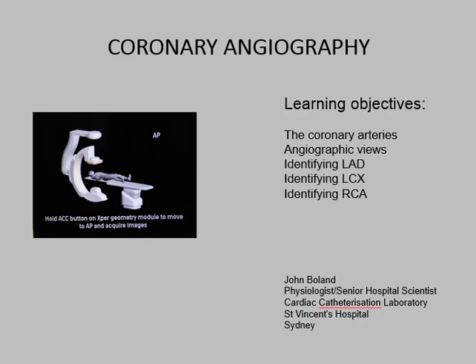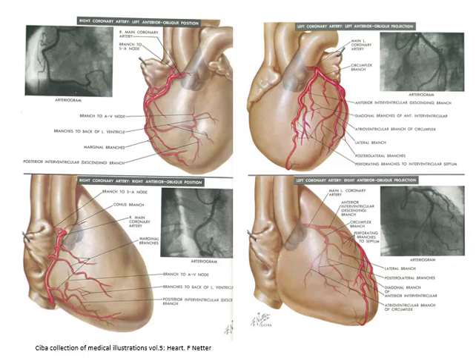My name is John Boland, and here we'll be looking at the coronary arteries in a little more detail, the various angiographic views we have to identify the LAD and the circumflex and the right coronary artery. This is a slide showing again a diagram of the heart with the vessels prominently shown for the right coronary artery on the left and the left coronary artery on the right.